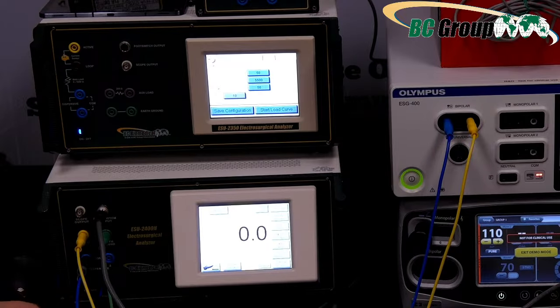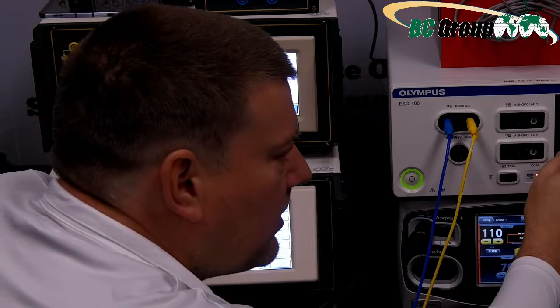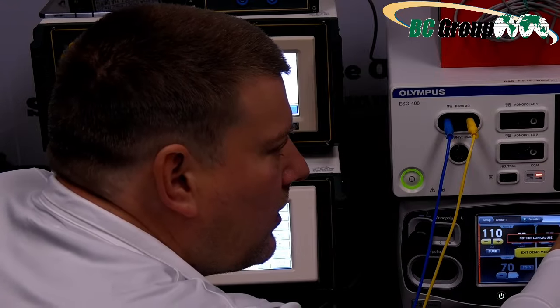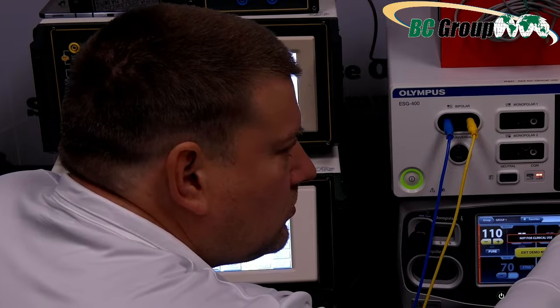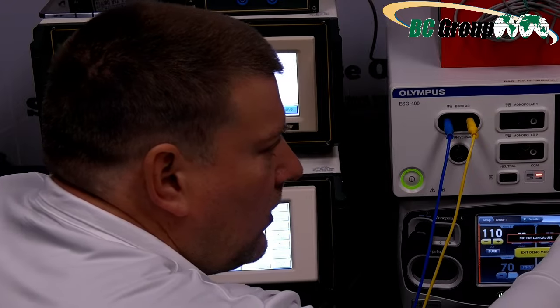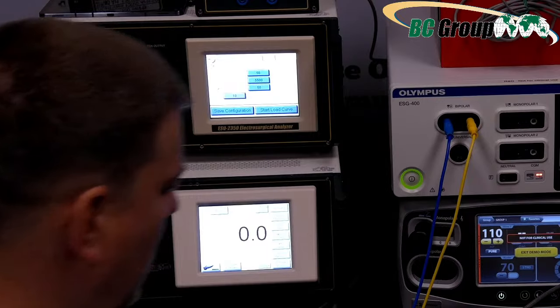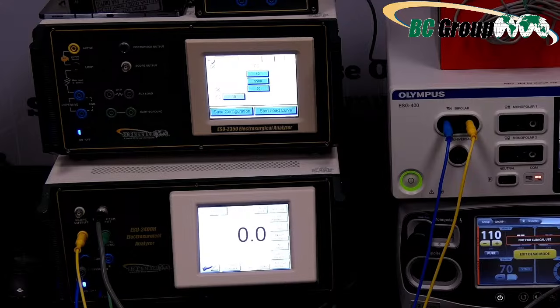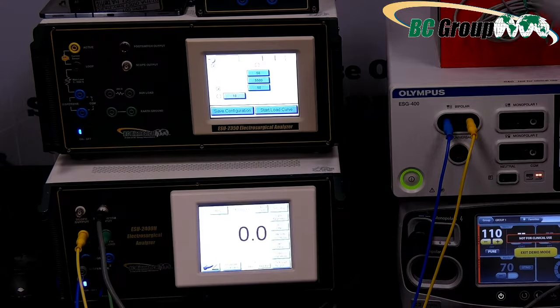This ESU up here. Again, guys, the banana plugs are kind of universal. Let's go up here and take it up. And let's see, do I have the foot control for this guy? All right, check this out.